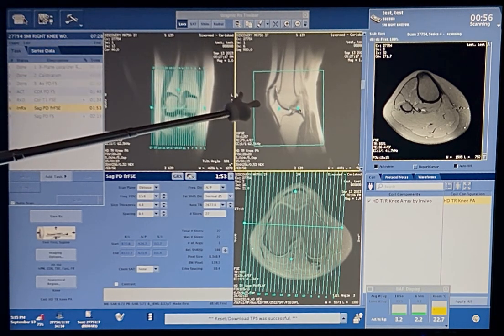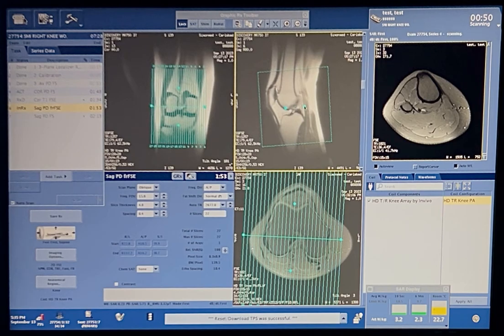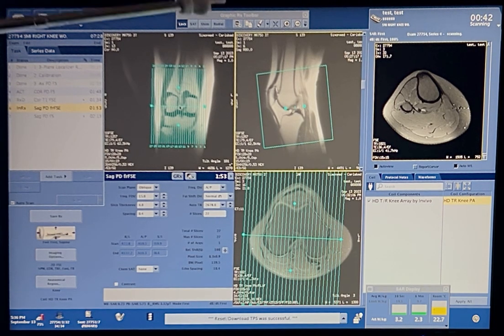So we have a lot of space up here, but nothing back here. Do I angle this one too? Yeah, I would. I'd rotate it however much you did in the last two. Perfect. Okay. And then, yeah.